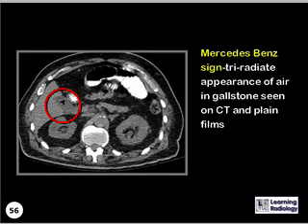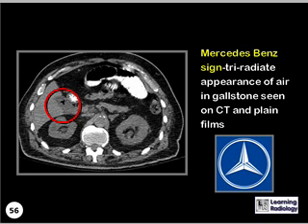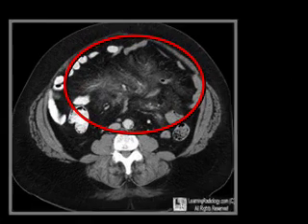This is the Mercedes-Benz sign, the triradiate appearance of air in a gallstone seen on CT and plain films. It's so called because of its resemblance to the car maker's logo. What sign is this?